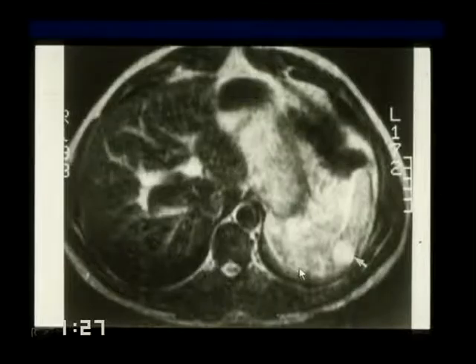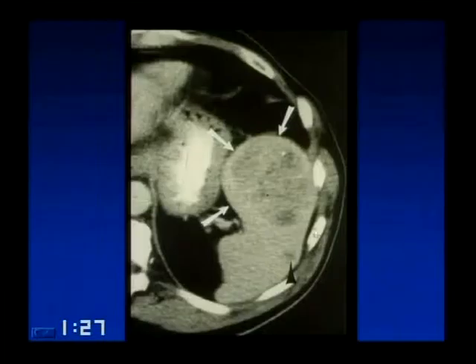Here's an MR showing that on T2-weighted images, just like in the liver, these are hyperintense. And here's one that bled. Here's a lesion in the anterior pole of the spleen, with calcification. Okay, let's use this as an unknown. Somebody shows you this. Patient has no known primary, no lymphoma. Even if there's no recognized trauma, the fact that there's two lesions, so two foci of abnormality separated by normal pulp, and there's a focus of calcification makes hemangioma more likely. Hemangioma is the most common incidental finding tumor in the spleen.